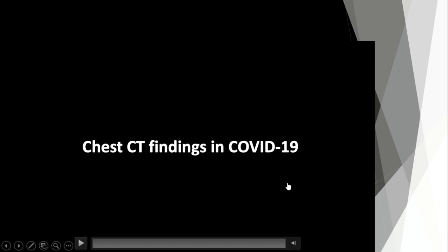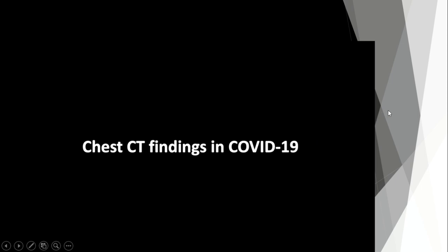I want to show you one small film. This is a short video that is designed to review the CT chest findings in COVID-19. And we're going to get to it right away by showing you cases. And we're going to define basic terms for the beginners as we go.